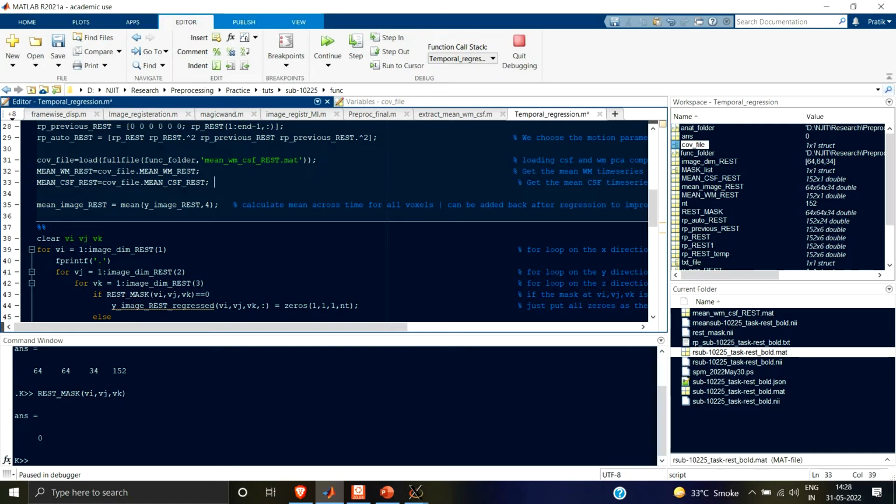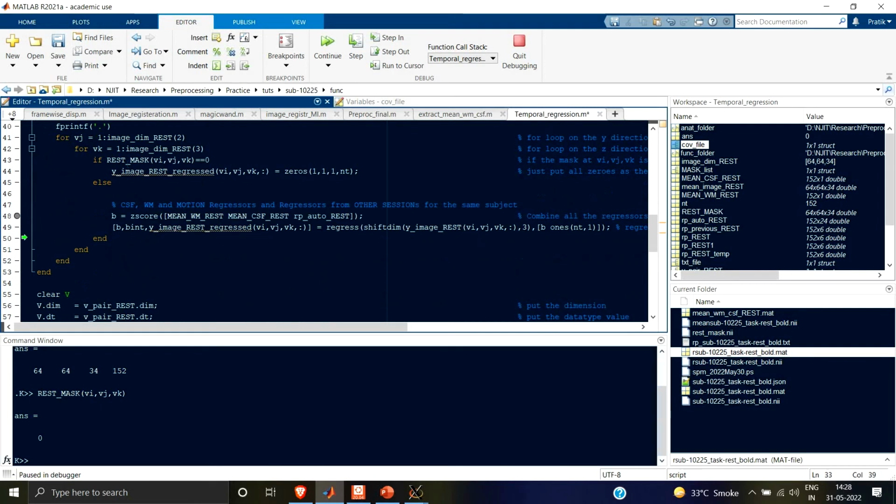So if you change the file, because now this is a new file, MATLAB is not going to stop over here, and hence it is giving a gray point. So what you can do then is just save the file. This star also says that the file is not saved. So just save the file. When you save the file, the execution will stop.